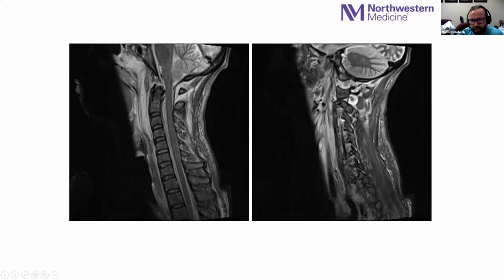Look, between the CAT scan and the MR, you can see the condyle C1 interval enlarging and becoming definitely worse than even the CAT scan. So you have this patient that you've diagnosed with this extremely unstable injury. It's a dislocation. What do you want to do next? Do you want to put this patient in traction to relocate him, or how do you want to treat them?